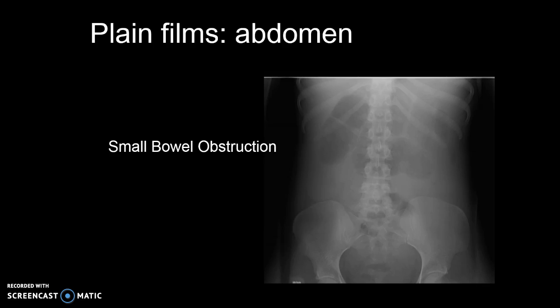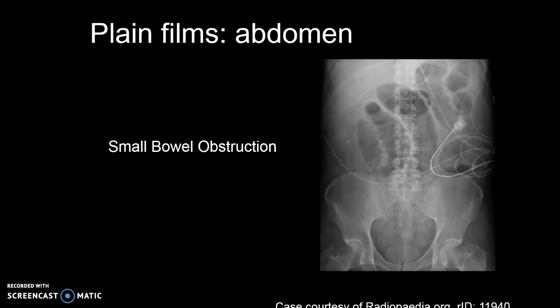If a patient presents with clinical features of obstruction, then radiologic assessment can be very useful in helping determine the level of obstruction. Any part of the bowel may be visible if it contains gas or air within the lumen. Gas and air are of low density and form a natural contrast against surrounding denser tissues. The upper limit of normal diameter of the bowel is generally accepted as 3 centimeters for the small bowel, 6 centimeters for the colon, and 9 centimeters for the cecum, which is the 3-6-9 rule.